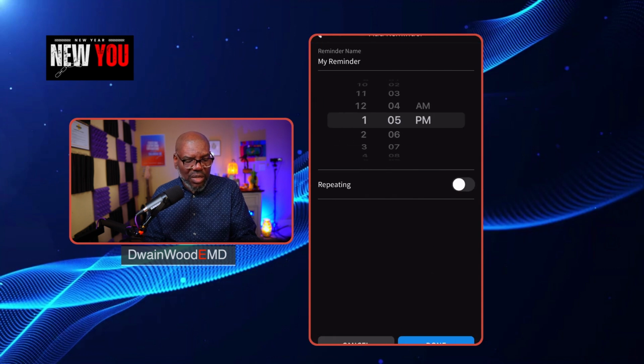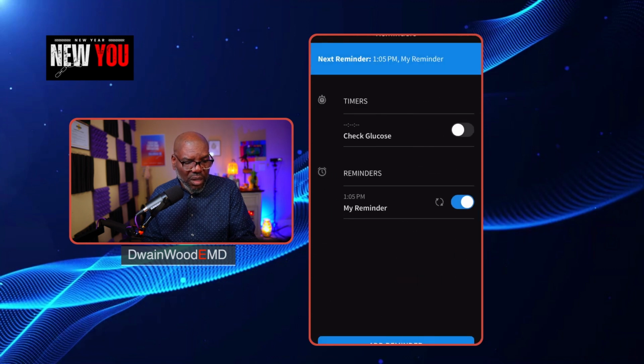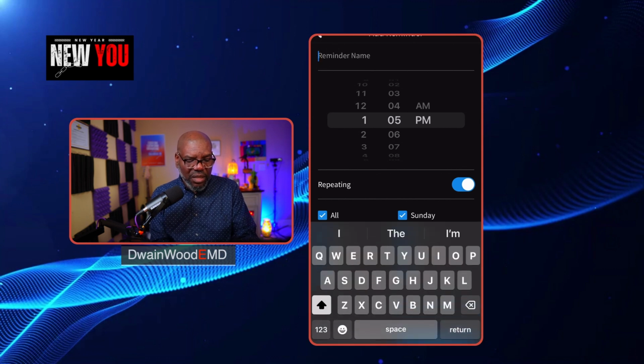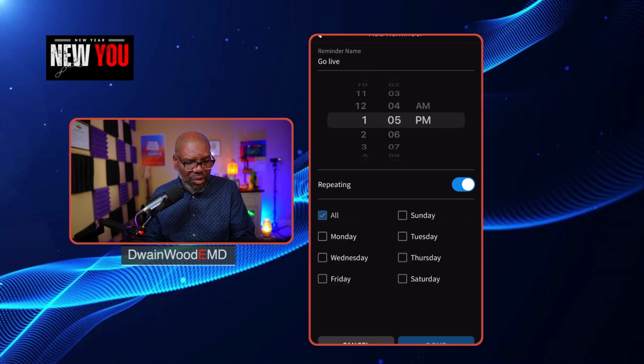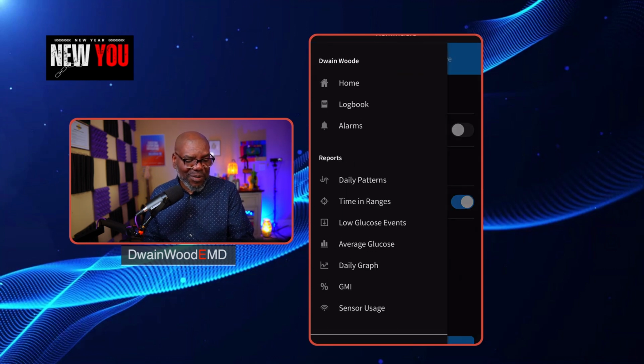Why don't we just go ahead and add one? Let's put one there and let's make it repeating. And we're going to say every day. Let's go back to that one and let's give it a name. Let's see, reminder, go live. And why don't we change this. It is repeating, but I'm going to just make it Mondays at 7 p.m., right, is when my show is. So I'll just make a reminder there. So there you go. Okay, go live. So that's going to go off tomorrow. I'm going to leave it.